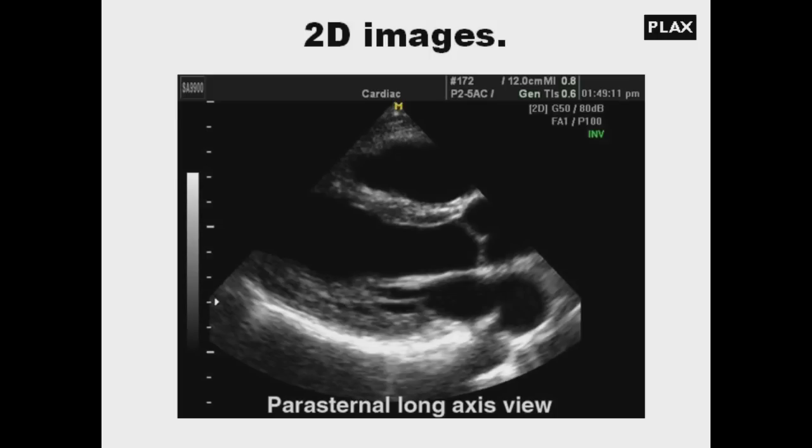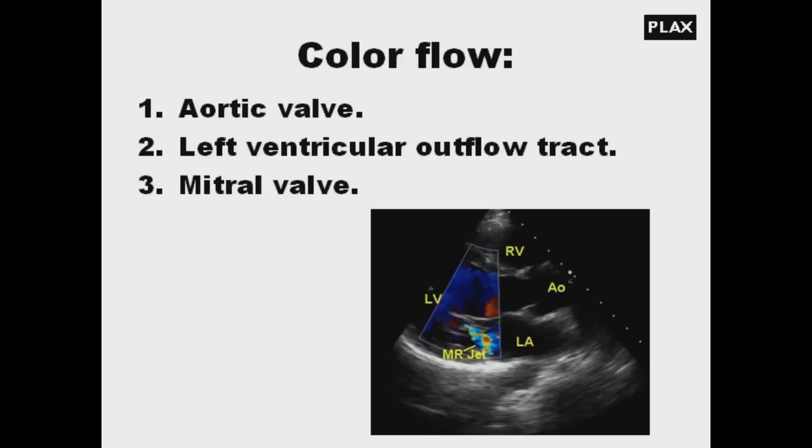The parasternal long-axis view provides a reliable picture of the function of the basilar portions of the anterior septum and posterior walls. Blood flow in this view is almost perpendicular to the ultrasound, and even color Doppler gives important information. The exact velocity of the blood is better recorded in apical views.